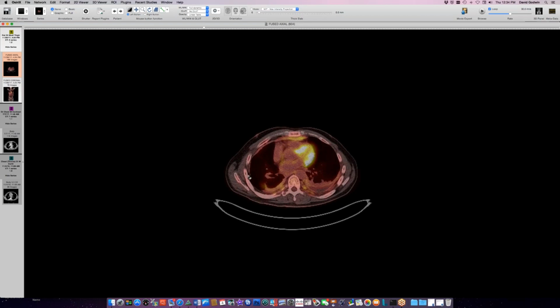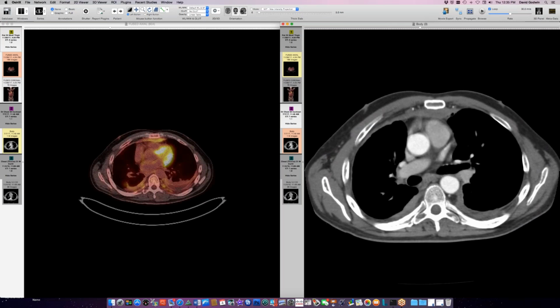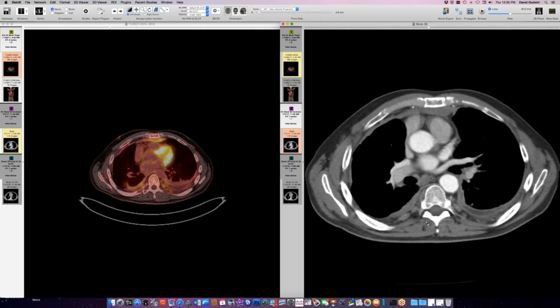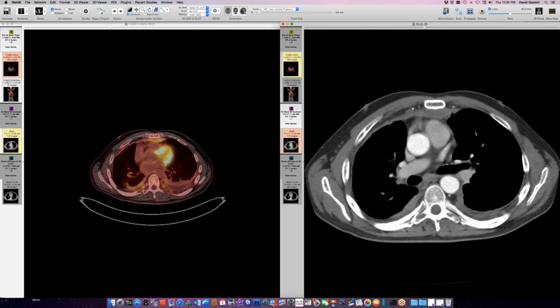Can you go back to David? Let's go. Because I think I've seen a case before where I just thought there was tissue in those locations, and maybe about halfway down the chest, the nodules about, where was it that I saw it? Right there. Look at all that tissue. Yeah, right there. And on the other side. That's impressive. I think they're discrete enough that nodes is a good idea, though. Don't you guys think that they're shaped like nodes? You have lymphoid tissue there? I mean, lymph nodes in that location? Well, this is an inflammatory process. He's got weird lymph nodes.